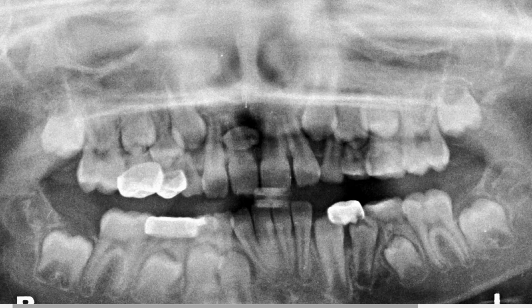So this video is a continuation of the previous video that talked about the positioning and visualization of Mesioden seen on panoramic radiograph and periapical radiograph. Since then, we have now captured a CBCT scan of this area, so I want to share that with you.